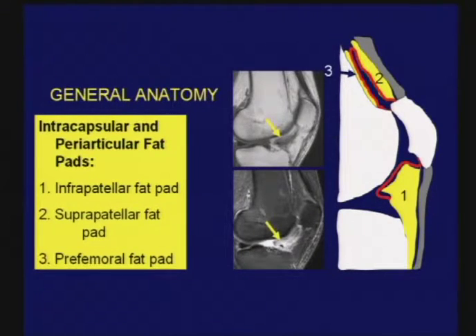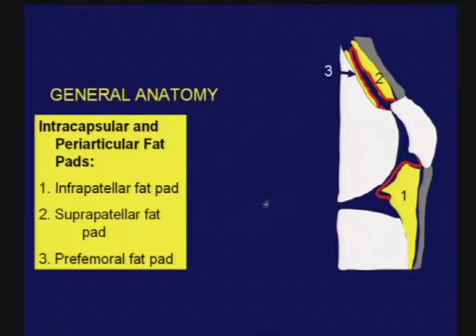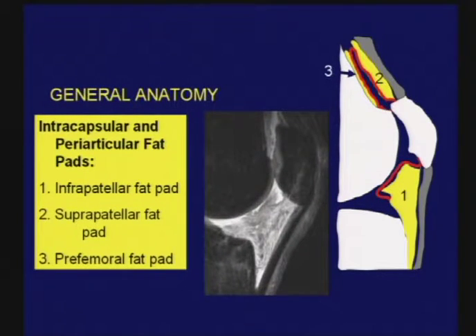There's another form of edema that occurs in Hoffa's fat pad that involves mainly the deep portion, as shown here. I suspect, although I have no proof, that this relates to fat pad impingement in certain positions of the knee. I've seen this more common in women than in men, and it again likely indicates some problem with the extensor mechanism. Diffuse involvement of Hoffa's fat pad is sometimes called Hoffa's disease, although the importance of it is not entirely clear, and the etiology is probably varied.